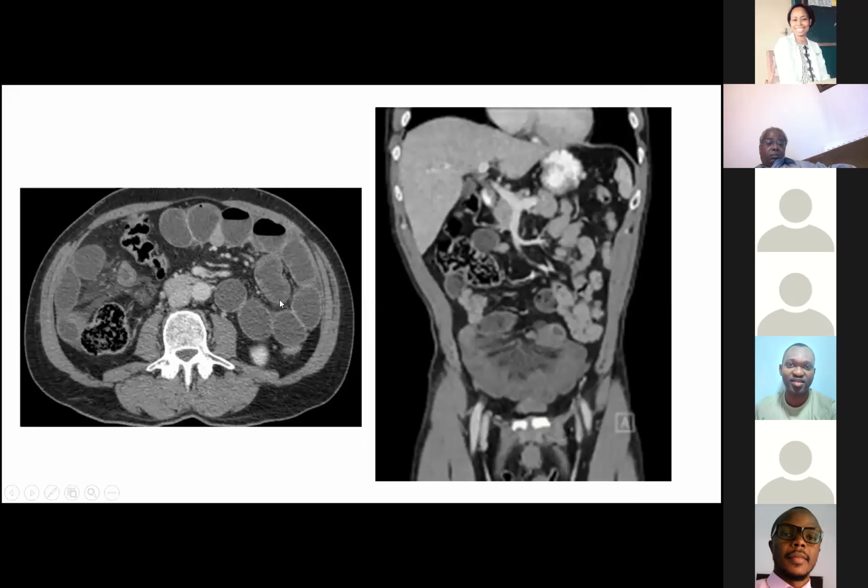And again, even in places such as where I work, where we have CT 24 hours effectively, we quite often have this worrying delay from plain film to CT scan, and it's inexplicable as well, because if you request a CT scan the minute your patient comes in, you can get a CT scan within a reasonably short space of time. But this patient, and these are two examples of the same thing.